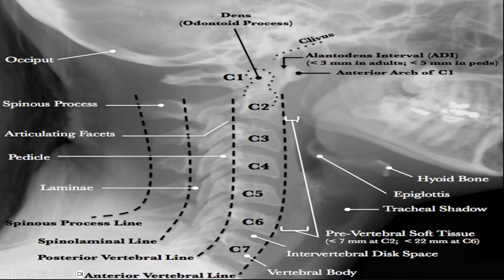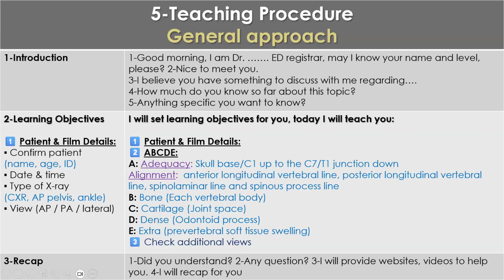So if more than that, it means swollen. What does swelling mean? Soft tissue swelling, sir. Infection or injury. Infection if it is a medical disease, or injury if trauma. Yes. Okay, and what is the next point?